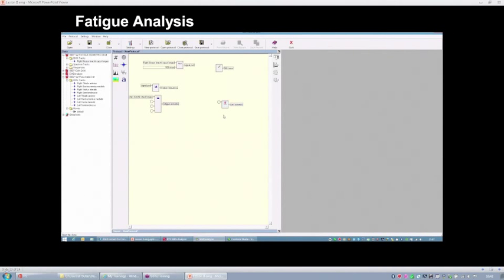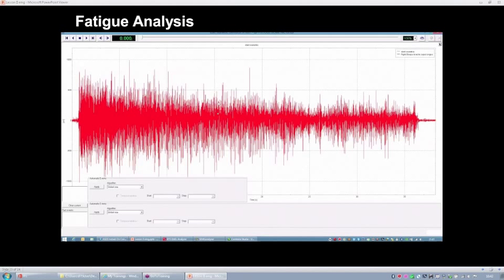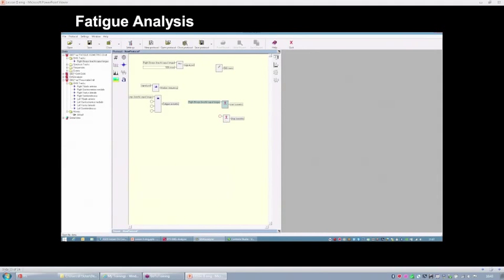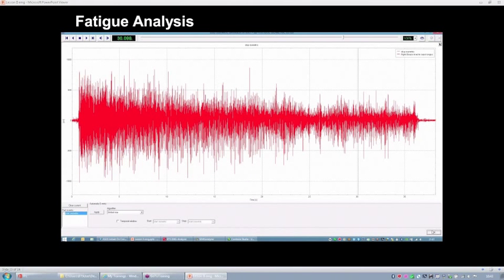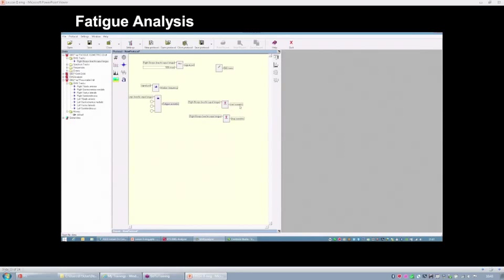So I'm going to define the start and the stop of the time window with respect to which I want to analyze the signal. So here we have an isometric contraction. I want to start from that event, and I want to stop at this one. So the start and stop events will be the other two inputs of this block.